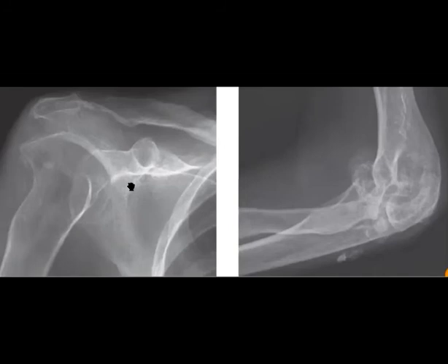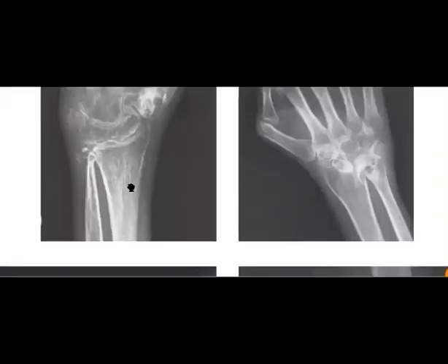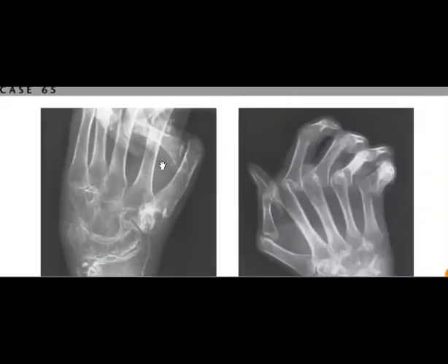Yes. So now, what is the most likely diagnosis? Is it rheumatoid, scleroderma, systemic? Do you have any clue? Maybe if you imagine that the acrosteolysis is evident in this case, maybe you can put scleroderma. Yes, Sarah, you can put scleroderma as your first top differential.